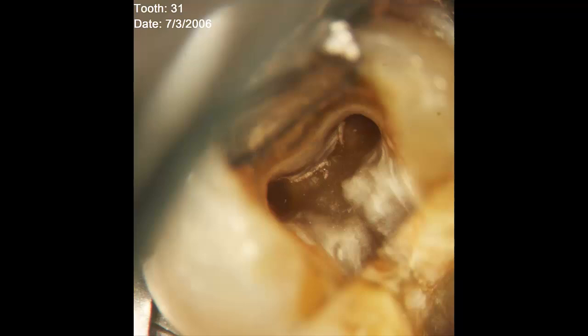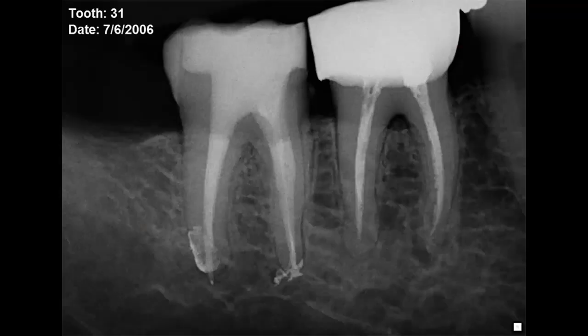Treatment was performed with the classic Schilder technique, utilizing hand files, multiple recapitulations to develop the apical prep, and copious amounts of irrigation. When the root canal system was obturated, one can see multiple apical ramifications filled. The tooth was immediately restored with a bonded composite resin. The tooth was then restored by his general dentist with a gold crown.